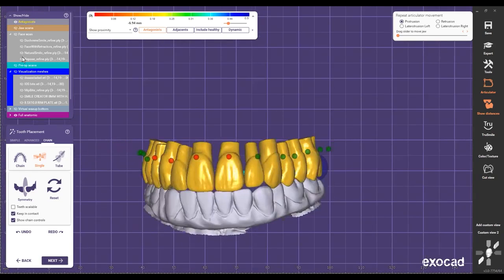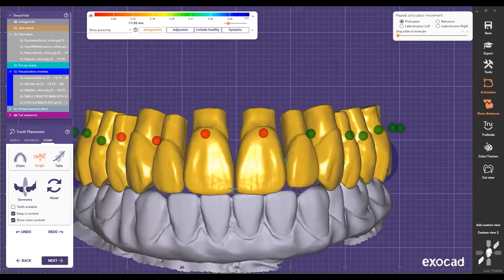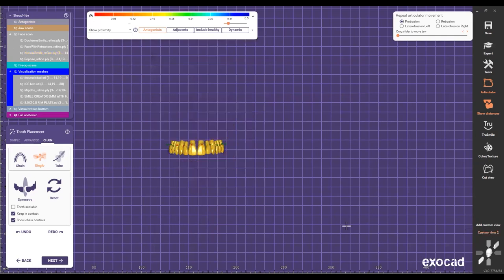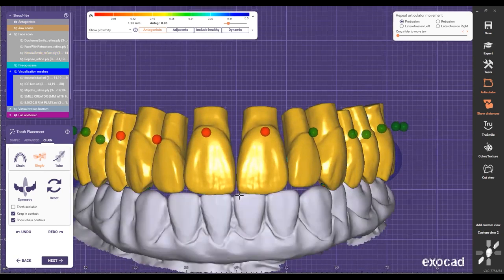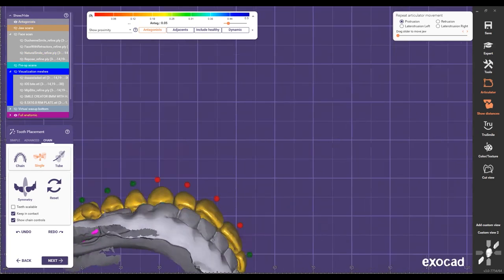Once I do this, now I can see that if it looks good in the face, it's gonna look good in the patient's mouth, okay? So now I can say, okay, now from 8 to the molar right there is already fixed. Everything is a nice occlusion, and I'm just gonna leave it there. Probably this one, I'm not gonna bring it out more.